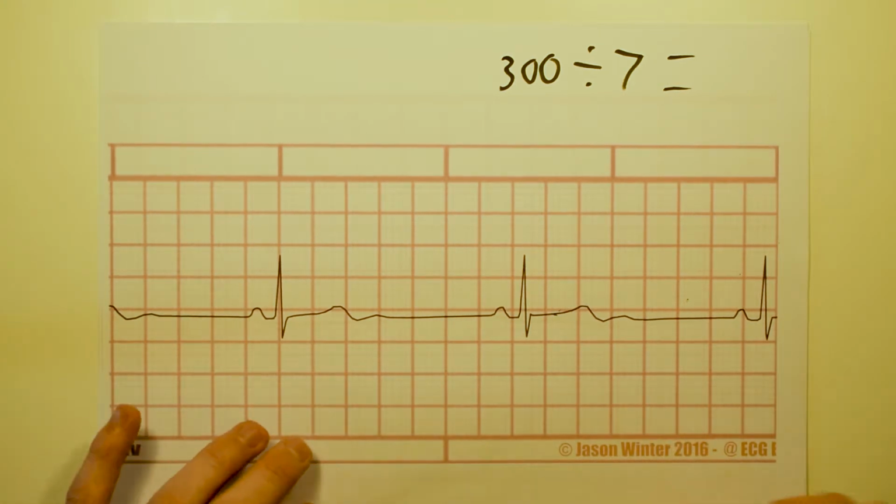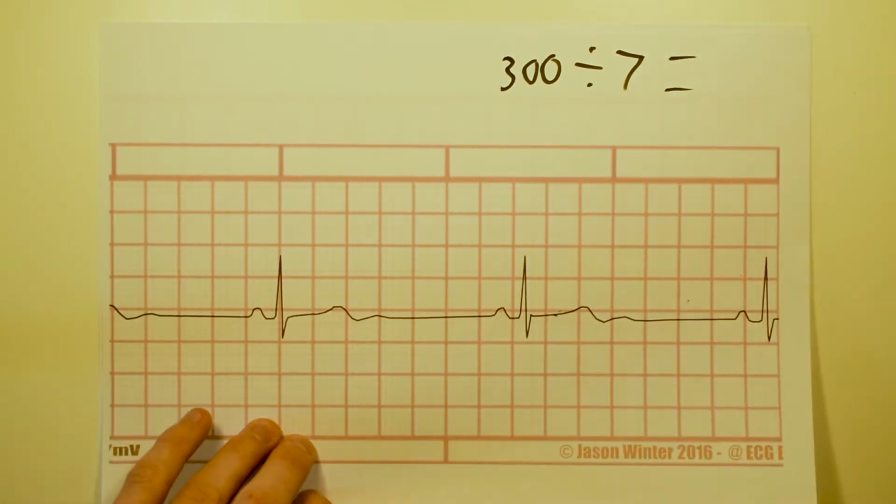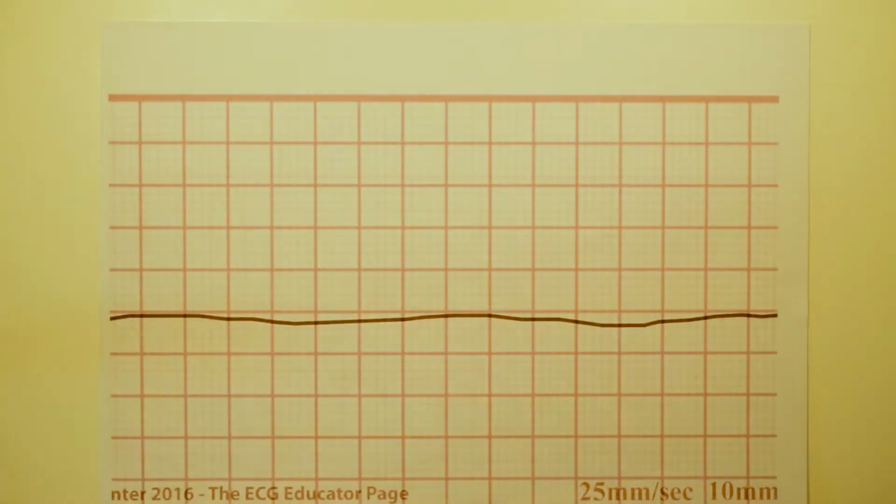So this would be called a bradycardia. Let's go to the next. All right. So this might look familiar.